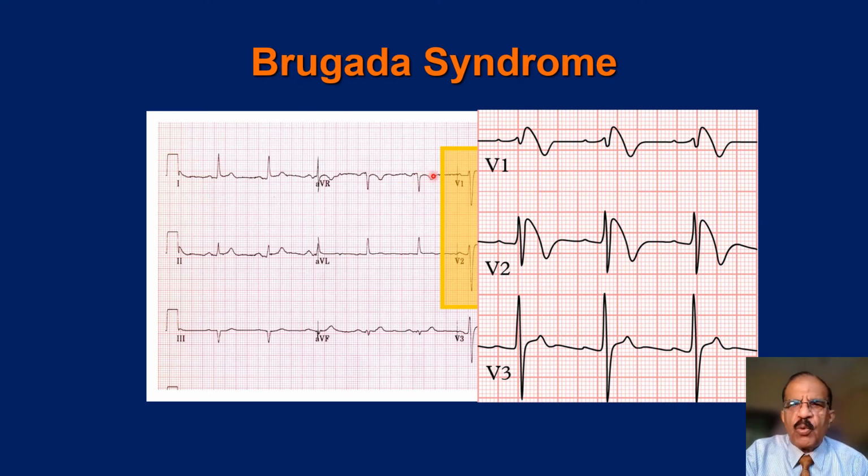So this is Brugada syndrome, and this may be responsible for sudden death. So if you have somebody who shows this ECG and he has a family history of sudden death, this may be called Brugada syndrome. You cannot make the definitive diagnosis of Brugada syndrome unless there is family history of sudden death or history of tachyarrhythmias. Just from the ECG abnormality, you may suspect.